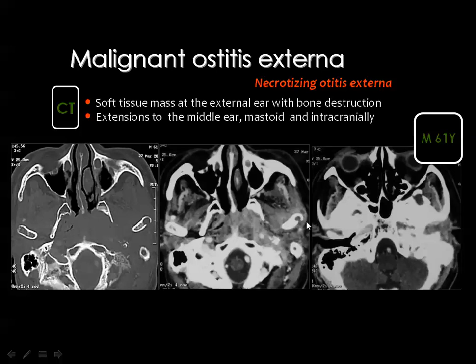Also, you can see the inflammation is involving the region around the temporomandibular joint with erosions of the mandibular head, and also involvement of the muscles of mastication, together with infiltration of the retropharyngeal soft tissue structures. And in the bone window image, you can see some erosive changes of the skull base bones.